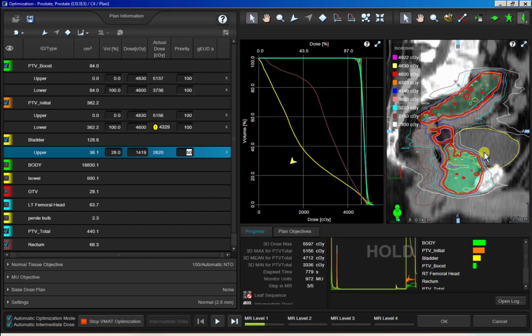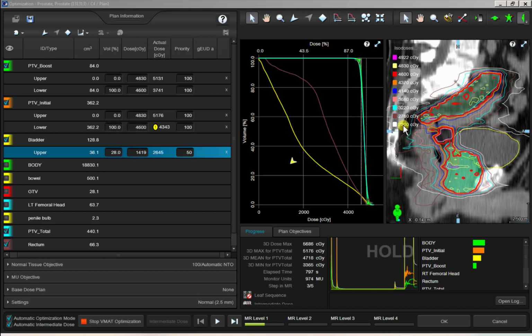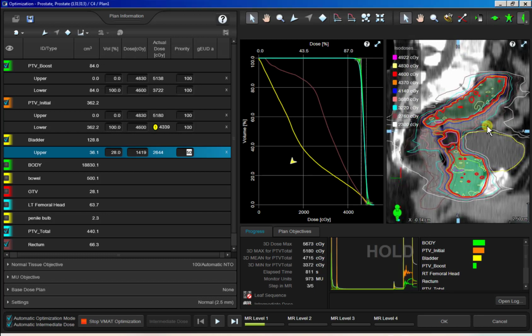One of the first things I'm going to tell you guys in regards to how to look at an isodose distribution and tell if it's properly optimized, or if you've pushed hard enough, is to just use the 50% isodose line. Okay, so if we look at this 50% line, which is the white line, you can see that white line is very tight to our PTV. If we look sagittally right here, we're carving a lot of that dose out of the bladder. Okay, that's pretty good. That's what you want to see.